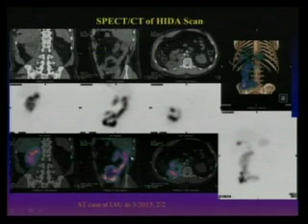Within the fluid collection, that drives from the inferior aspect of the liver. So this is a location, and then you follow that. What's this look like? That looks like a little bowel. Yeah. So that's loops of bowel, no bile leak. Oh, this is different. That's the coronal view, and then of course you see all the loops of bowel.